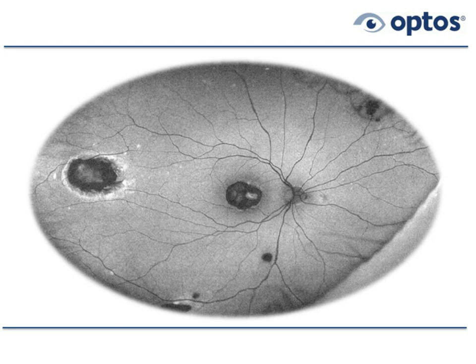That lesion doesn't necessarily have to be treated. We usually don't treat toxoplasmosis unless it's threatening the macula. That one's not, and the macula's already gone, or threatening the disc. This one's pretty much in the mid to far periphery, and will probably burn itself out, but this patient should still be followed carefully. The point being, autofluorescence is giving us additional information in this instance, which was not obvious in just the color images.